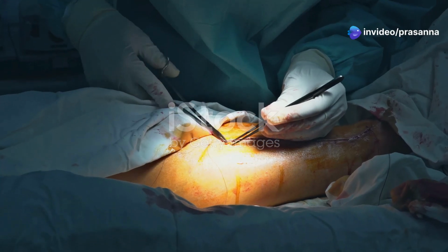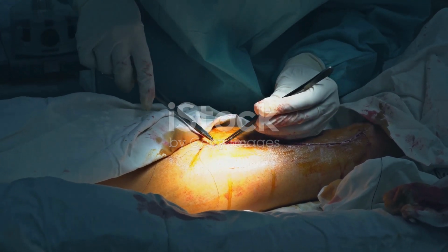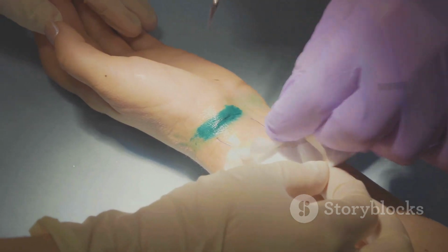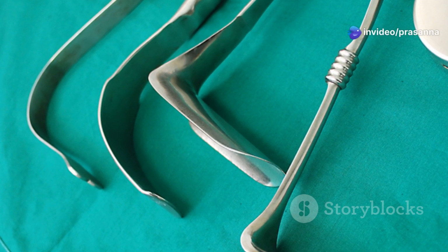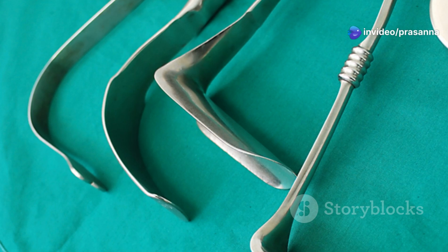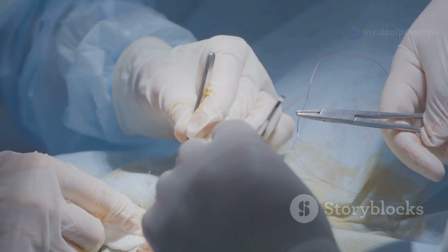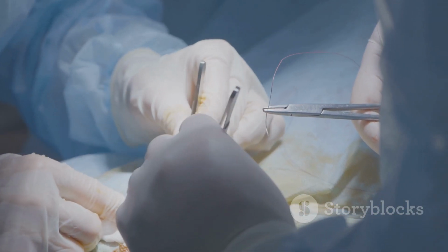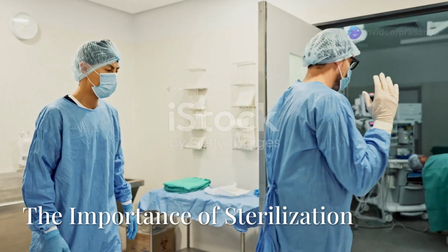Surgical suture comes in various materials, such as absorbable sutures that dissolve over time and non-absorbable sutures that need to be removed later. The choice of suture material depends on the type of tissue being sutured and the desired wound healing properties. Imagine these sutures as specialized threads, each with unique characteristics that make them suitable for different types of closures.